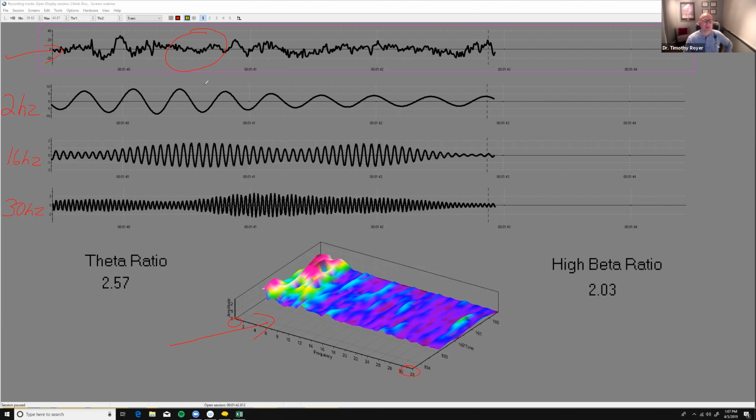But before you look at that, you have to understand, here is a 2 hertz frequency. It's very interesting if I start at 1 minute and 40 seconds, which is right here, okay? And I go to 1:41, right here, what you'll see is we get 1 and we get 2 hertz. So that means it's cycled twice.